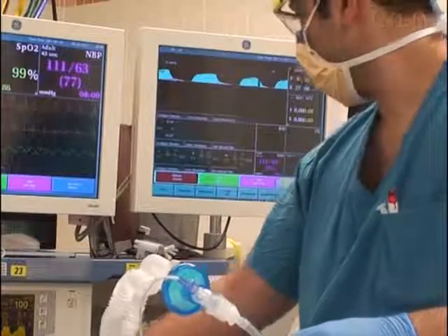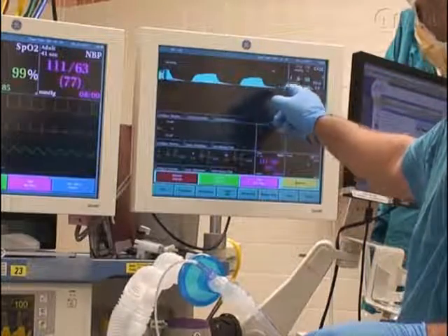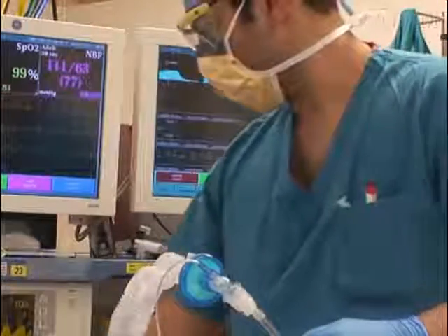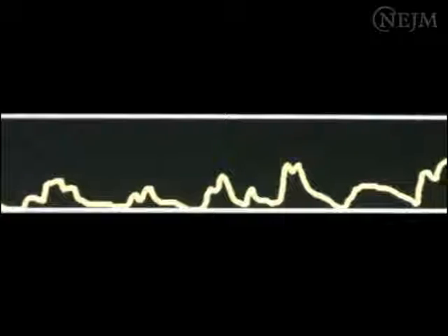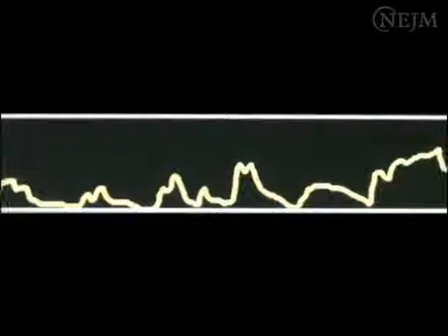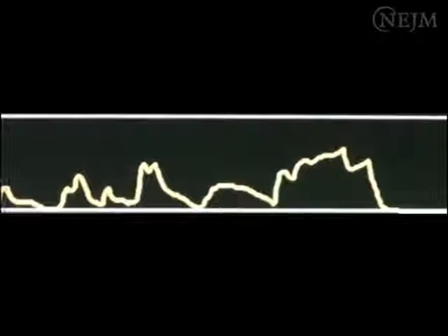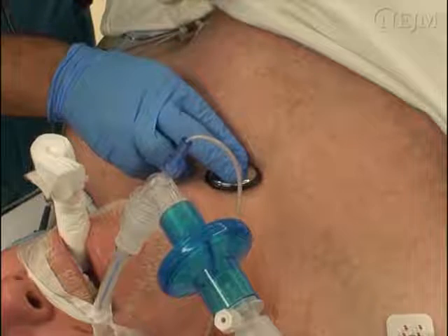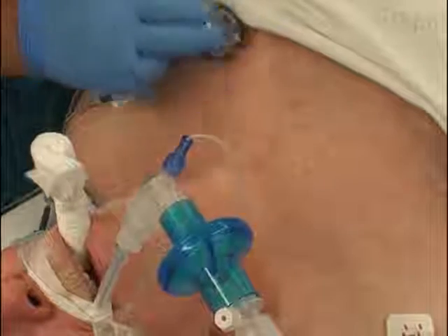Capnography is valuable for monitoring a patient's respiratory status. However, it is important to be aware of circumstances that may affect its reliability and to be able to recognize and interpret abnormal waveforms that may result from pathologic features or from technical difficulties. Capnograms must always be interpreted in conjunction with other physiological variables, and clinical judgment is important.